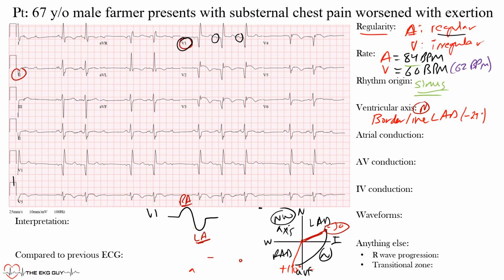And for left atrial enlargement, you want at least 1 millimeter wide and 1 millimeter deep, okay? And it's hard to see here. I'll kind of erase that, but it is actually present there, okay? So we do make it there, but another lead to look at is lead 2 or any of the inferior leads, okay? Lead 2 is a good one to look at, and what you want to look for in left atrial enlargement is something like this.